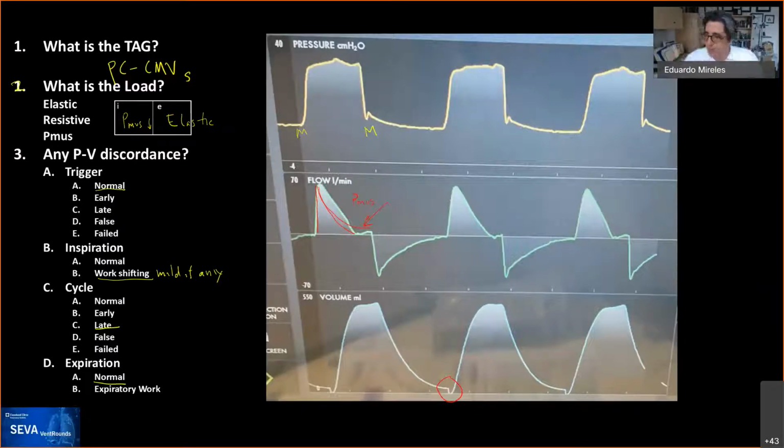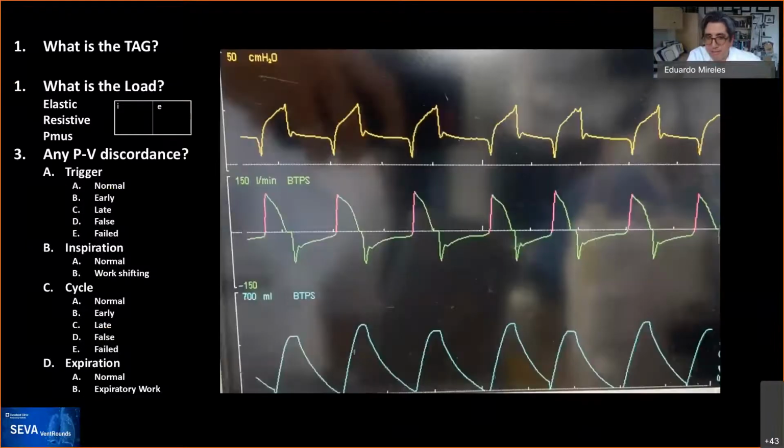All righty. So I'm going to ask if there's anybody else that wants to jump into the discussion and read the next curve, and then I will show it. Anybody? Maybe if I show it. Right, I'll show it. There you go. Anybody wants to read it?